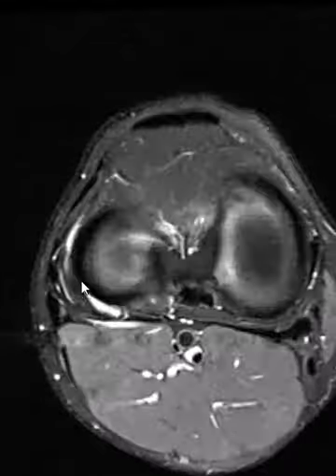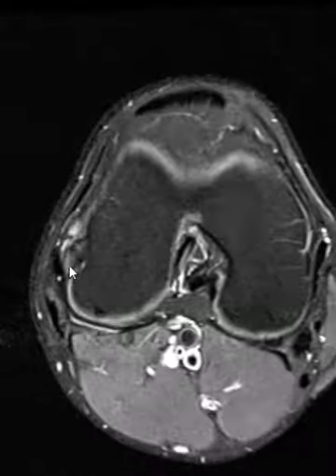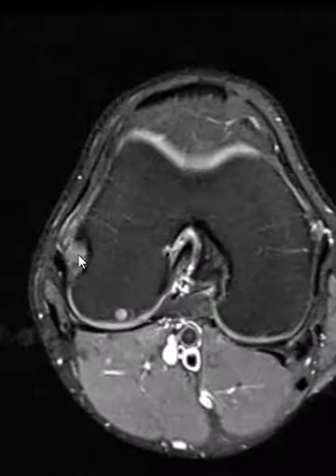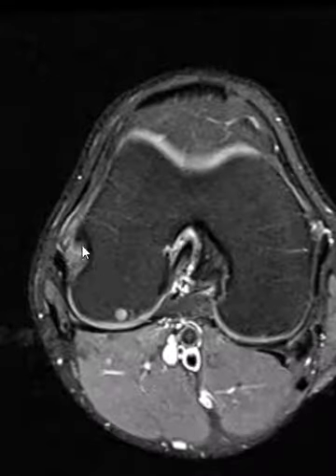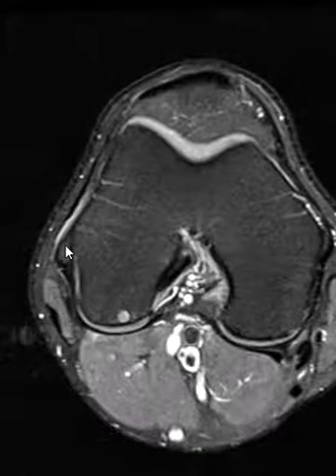It's bright. And if we come down here, we can see the popliteus wrapping around the back. It's called the popliteus hiatus in here. Go back up, up, up, and you can see right here where it attaches, just too foggy. So a partial tear or strain of the popliteus tendon origin, and this injury of the fibular collateral ligament origin.